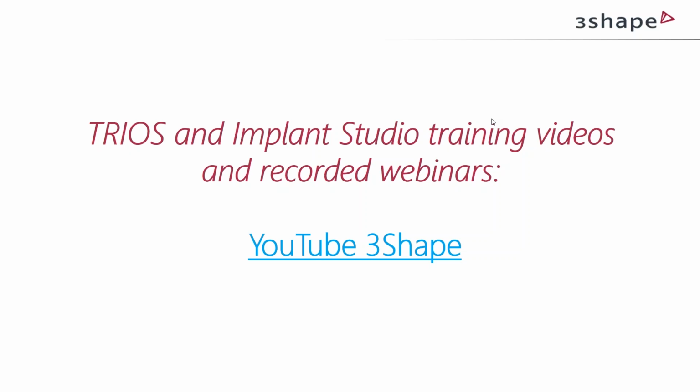Implant Studio is a software that comes in different configurations, so you can configure it to your needs. If you're in the dental practice or in the dental lab, your needs might be a little bit different. And of course, if you're already working with 3Shape, then Implant Studio is an add-on to the ecosystem and the environment that you already know.